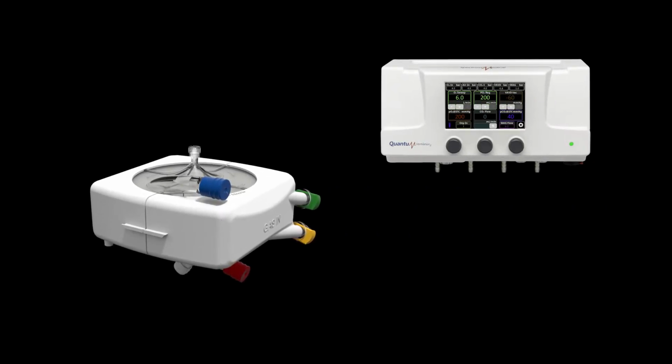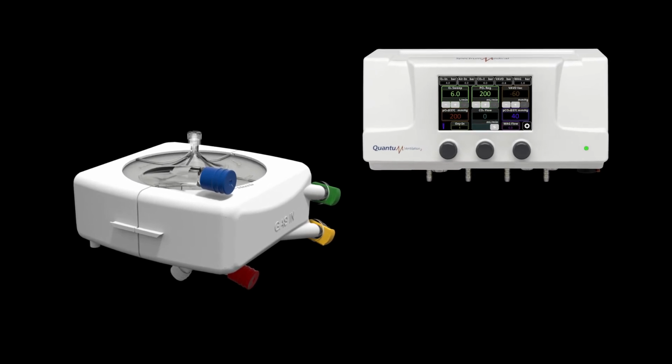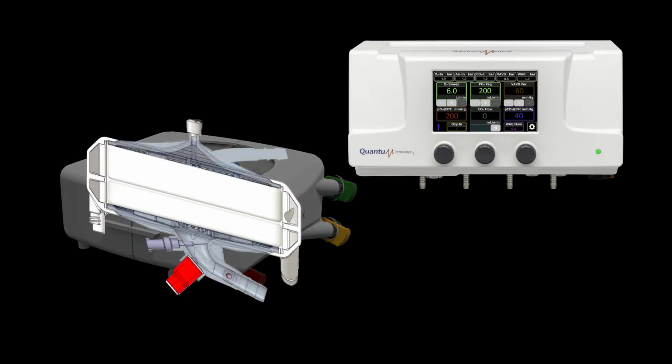Spectrum Medical's ventilation technology and dual-chamber oxygenator are specifically designed to eliminate nitrogen in the sweep gas, while also limiting oxygen pressure in the blood. Creating a VQ mismatch by passing blood through the oxygenator while limiting the total surface area of ventilated fibers. The resultant PaO2 is much lower than if all the fibers were ventilated.